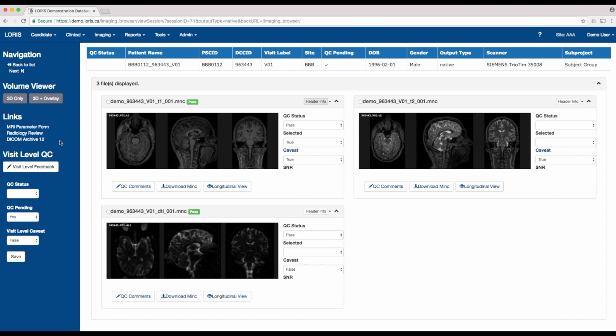In addition, raw DICOM files are also packaged and stored alongside MINC files, and conversion to other imaging formats such as NIFTIs is available as well. Within the scan acquisition page, each individual scan can be downloaded directly to your desktop by clicking on the download link.